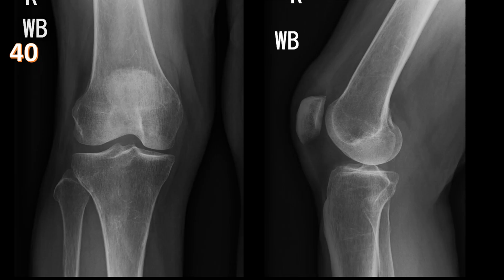Case number 40, a patient that came with knee pain and got radiographs, and it looked pretty negative.